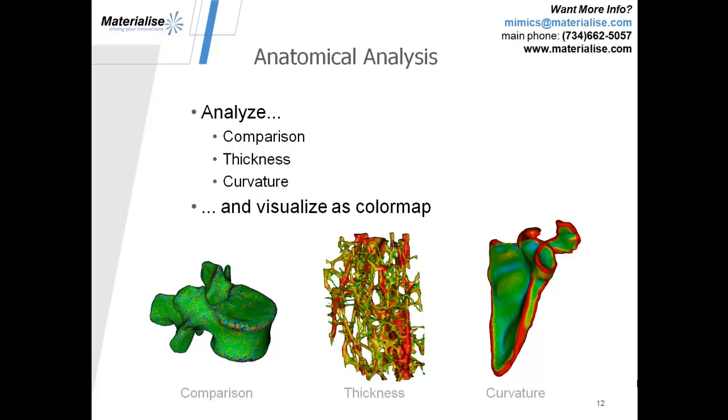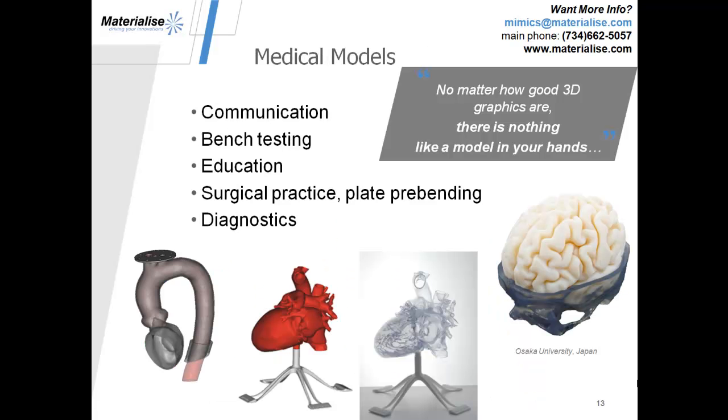Or even looking at the curvature. Where's the highest curvature on your anatomical model? After doing an analysis within the software, sometimes it's also nice to bring that analysis into the physical world. Here we can print models that you've created in Mimics and bring them into the physical world for communication with other team members or clinicians, or even into the testing world and create benchtop test models, maybe for cyclic testing or loading conditions or insertion testing.